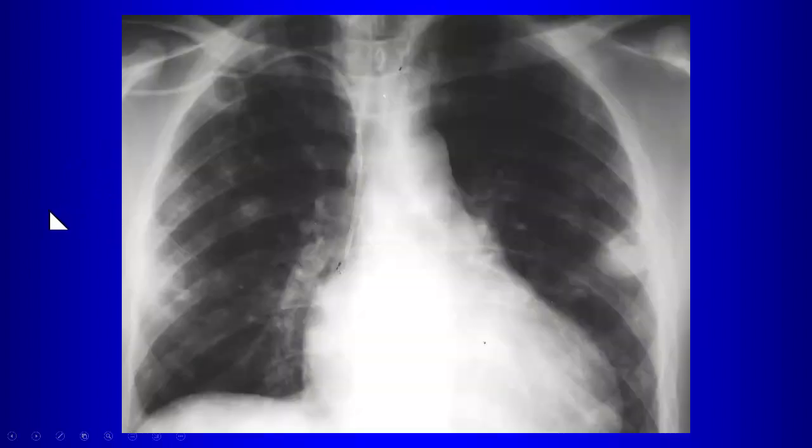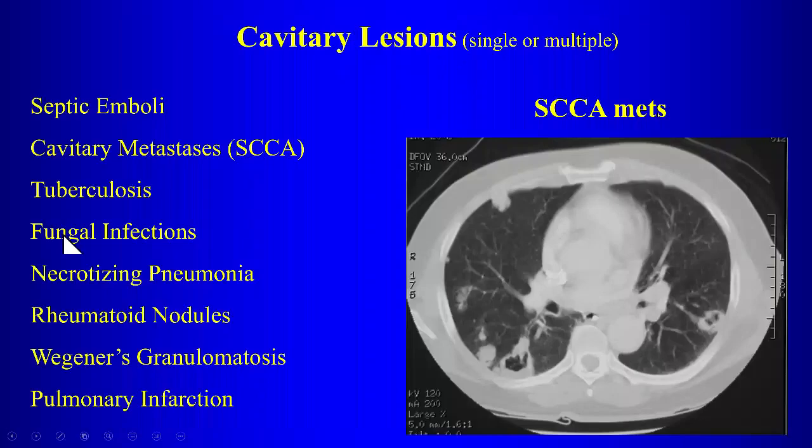All right. If you look at this X-ray, pretty much just one diagnosis should come to mind. And what is that diagnosis? They have a central line, and the finding on the chest radiograph is what? Yeah, the lesions are cavitary, but also in the periphery. So the peripheral cavitary lesions is the classic finding associated with septic emboli, and this person has a central line, so there's a risk factor here for septic emboli. So septic emboli would be a good choice there.